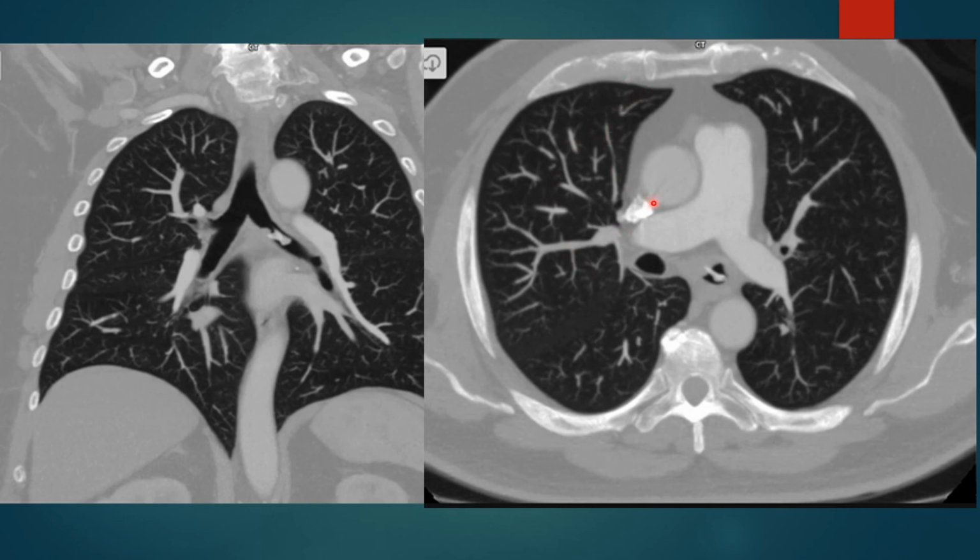An acute hemorrhage, contrast, and calcifications in bone, like right here. You can see your ribs are hyperdense or bright with the high Hounsfield units, up to positive 3,000 for dense bone. Just posterior, you can see we're past the bifurcation. We're about this level right here. You can see the foreign body in the left main stem bronchus as well as the right. The descending aorta, it's a little hard to appreciate, but you have your azygous vein, as well as your thoracic duct would be right here. Given these structures are present, I would say this is about the T5 level or the main pulmonary artery level.